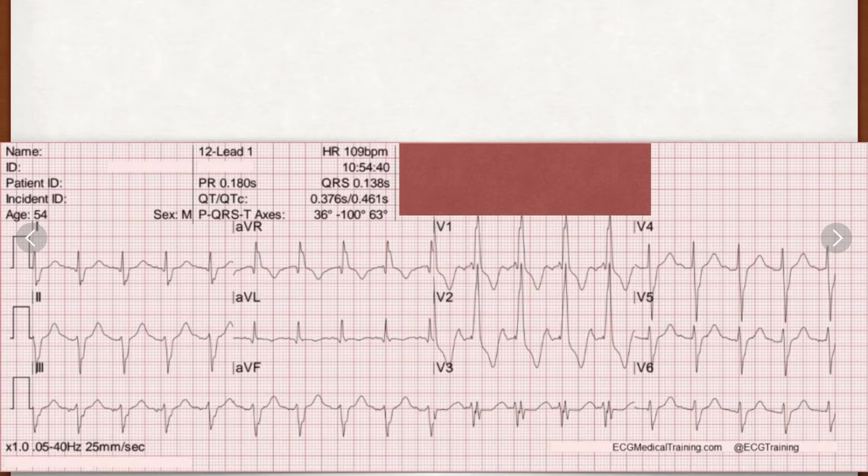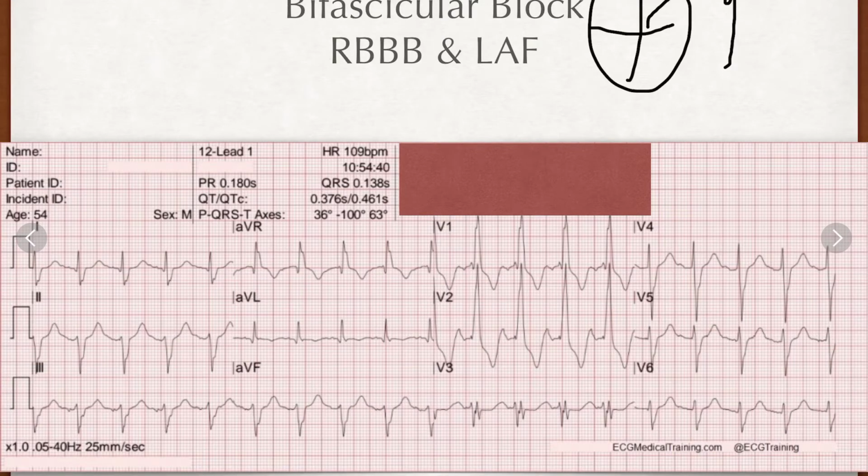All right, this doesn't look normal. Again, a wide QRS complex. I have a terminal R prime wave, so that makes me think I have a right bundle branch block. Do I have axis deviation? Probably +1, definitely -F. So looking at my quadrant, going towards 1, away from foot, puts me into left axis deviation. And then do I have a Q1? I do. Do I have an S3? I do. So that's a right bundle branch with a left anterior fascicle block.